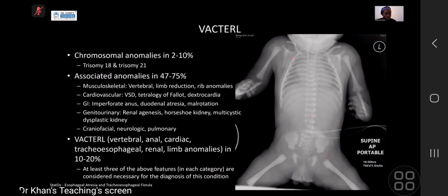I just wanted to mention about the UVC and the UAC. Neonatal chest radiographs tend to have multiple lines in situ. So as candidate 3 did there, you need to assess the lines and check the positions first before you then go on to present the pertinent findings in the chest or abdomen.